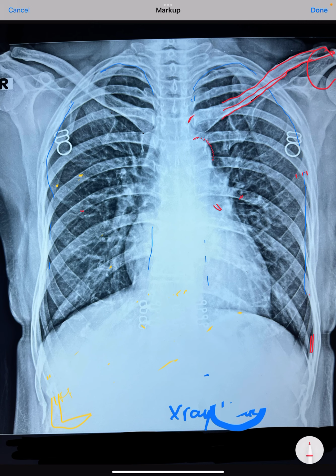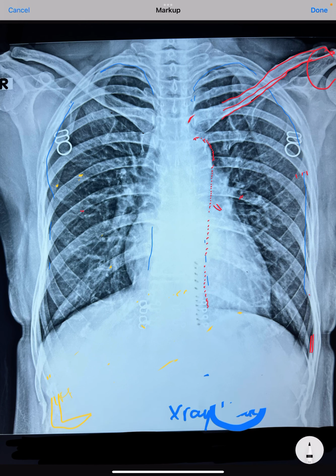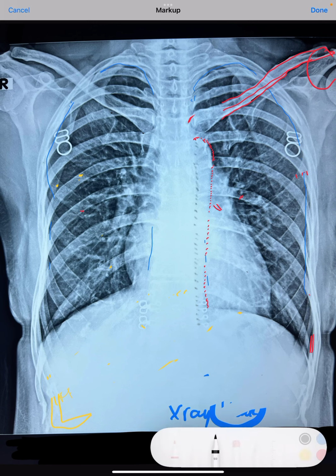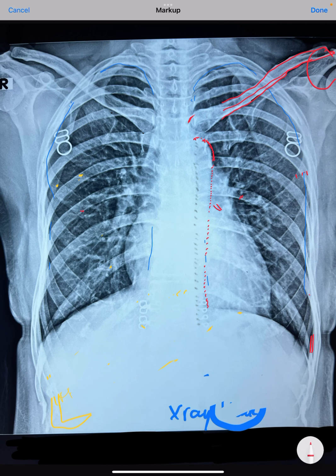This is the aorta, which is the largest artery of the body, and you can simply trace this aorta here. This is the line which you can clearly see. This is the line of the aorta, whereas the vertebral line, if you can trace, is here. So this is the vertebral line, or the central line of these vertebrae, and this is the para-aortic line, which we can very clearly see.